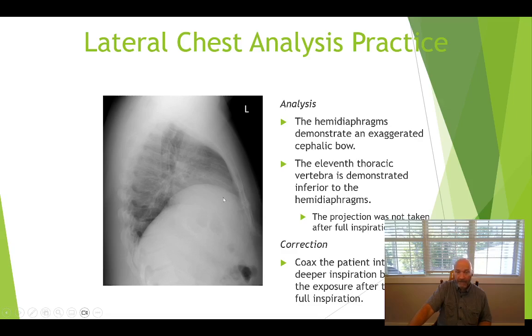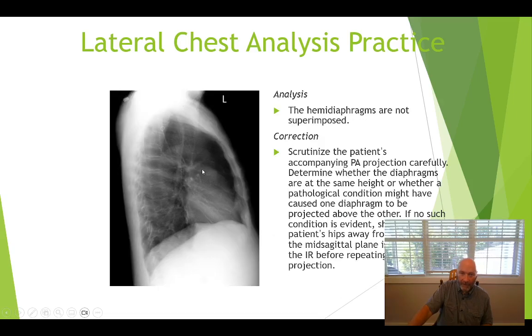So this one, the point that this image is trying to make is this was probably shot on exhalation. Maybe the patient misunderstood the instructions, or maybe they heard take in a big deep breath, but they didn't hear hold your breath. So this was really what a radiologist would call a poor inspirational effort. Really, it was just exhalation is all it was. So the high dome of the diaphragm and the very small amount of lung tissue that we have is a good indication of what we're looking at there.